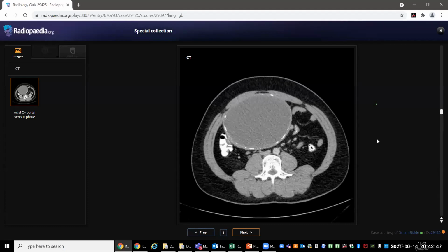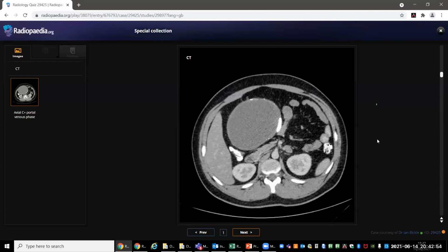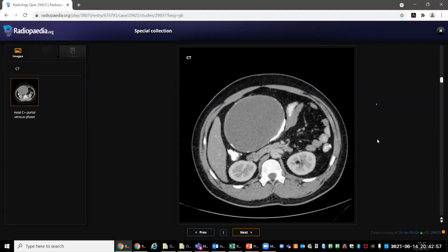So I would keep mesenteric cyst as the prime differential and inform the clinician, because this patient is having pressure symptoms, to have a surgical management of this patient. What would you recommend? One thing I would recommend is, because it's very close to the anterior abdominal wall, an interventional radiologist can be involved to have what we call the ultrasound guided aspiration. Would you be happy to aspirate this? By aspiration, I mean just for the sake of cytology, the surgery would have to go in for the definite management.